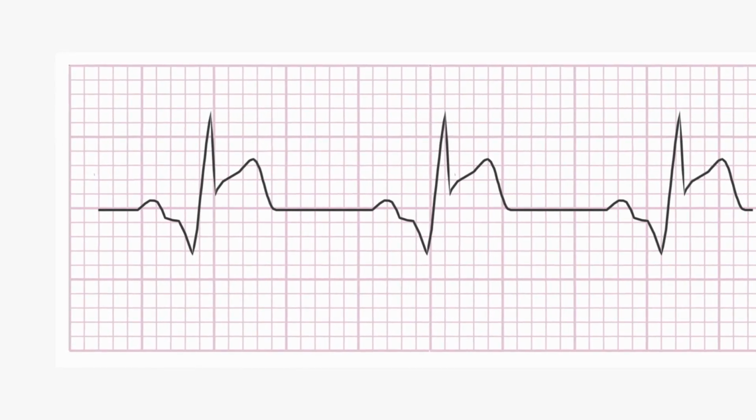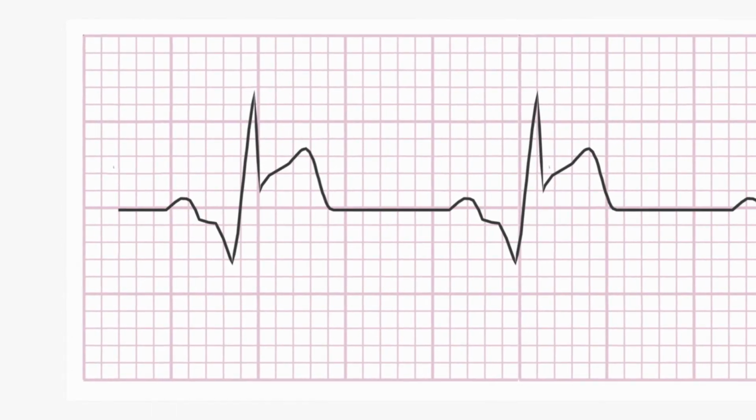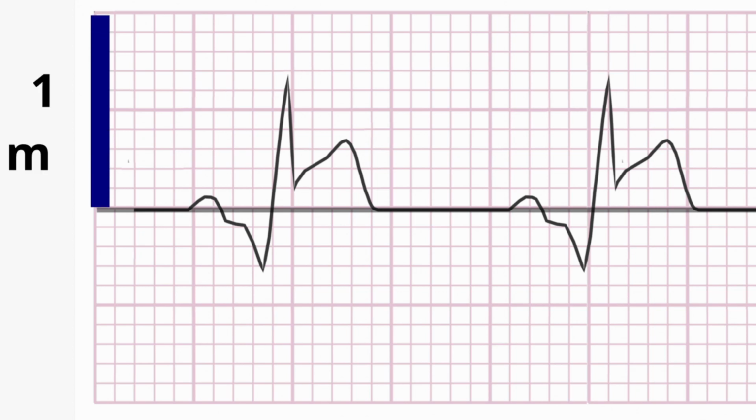We needed to define all of this before we talked about the vertical axis on our paper, because the vertical axis measures voltage, and voltage changes on the EKG are usually relative to the baseline. Each millimeter is 0.1 millivolts, so 2 large boxes, that is 10 small boxes, is 1 millivolt. In common parlance, voltages are almost always expressed in millimeters rather than in millivolts. So unlike time, where we talk about milliseconds and seconds, instead of saying 0.2 millivolts of ST elevation, we're normally going to say 2 millimeters of ST elevation. That one, at least, I think is a little easier.